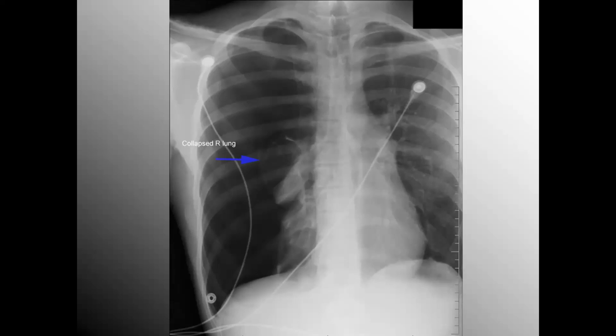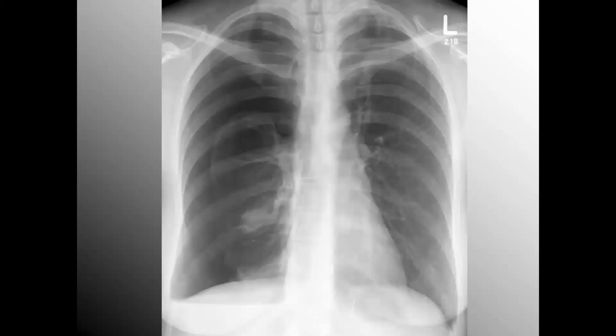All right, hopefully you're getting warmed up because these aren't labeled coming up. So start with your systematic approach. If you're systematic, you won't miss too much. Don't try to jump out there and find the abnormality. Some of these are more obvious than others. But just like on any diagnostic test, use a systematic approach.